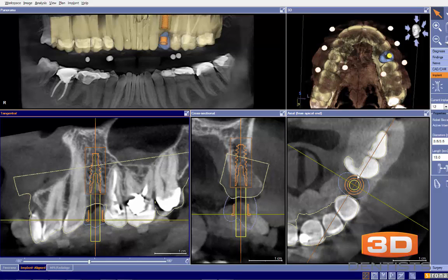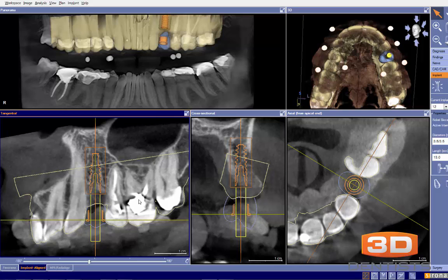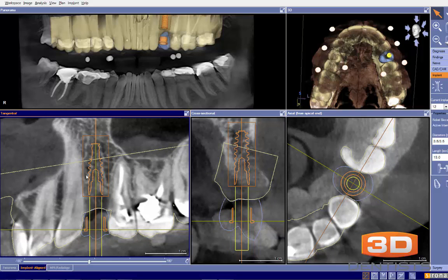And in doing that, now we've collided with our adjacent tooth here. So then I would just use my tilt feature and tilt. There we go. Now that takes care of the root spacing potential issue there. Again, it was very close, minor changes here.